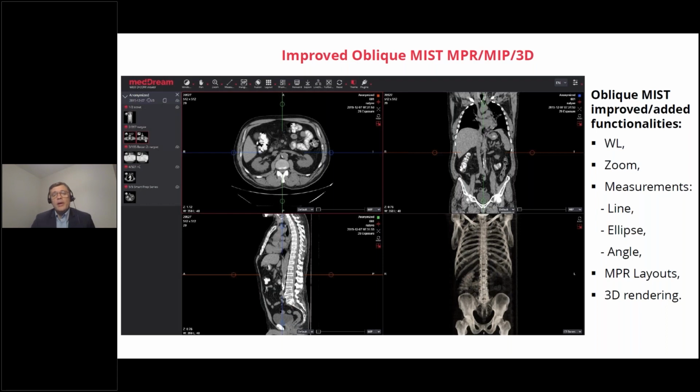And as you remember, this is based on end-user rendering. So in the case of slow internet, you can preload the study to your browser and work without any latencies and without the performance issues you faced in our past engine, which was based on server-side rendering and needed 4 megabits of bandwidth allocated for every user. This new MPR feature can work even on kilobits of bandwidth, because when you preload the data it is rendered on your device, there is no latency, and you feel the performance as on a workstation.